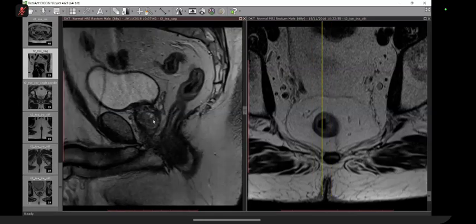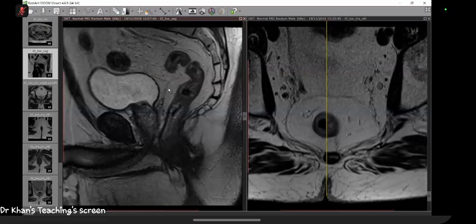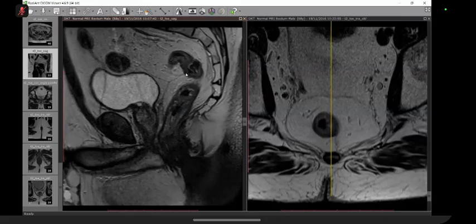You can see that this is the prostate and this is the seminal vesicle. What do you think is happening here? What is this? Peritoneal reflection. Do you see this? This is attached. You can imagine that this part of rectum, which is anterior to this part, is peritoneal cavity. So if a tumor was sitting here and it breaches the muscularis, it goes into the peritoneal cavity.